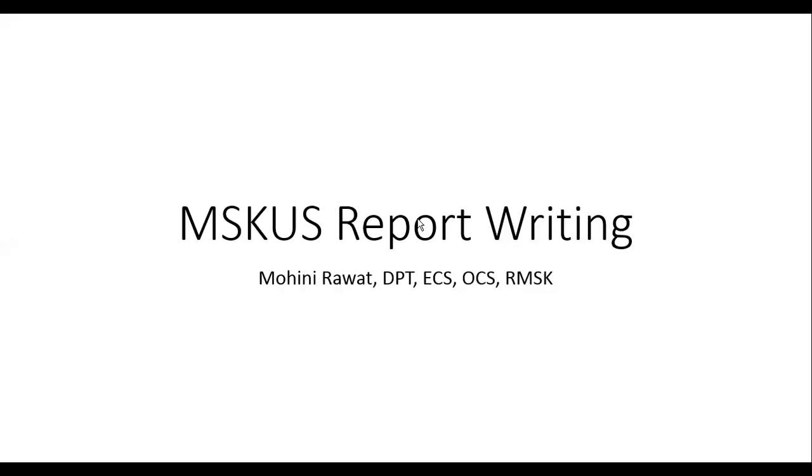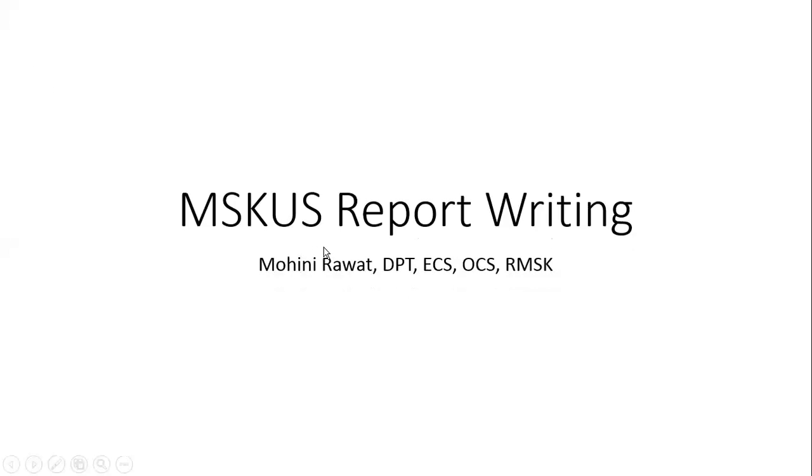Okay, welcome everyone. Tonight's webinar is on report writing again. I have some images. We'll discuss them and come up with a report impression, an ultrasound impression for those images, and discuss those findings, how we analyze the images to come up with the impression.